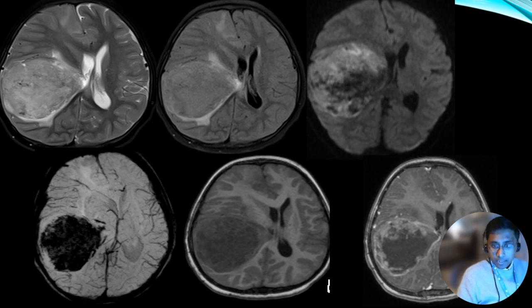Let's go on to another subtype of the high-grade glioma. So what we see here is a diffuse expansile mass which is involving the right cerebral hemisphere, predominantly involving the right temporal lobe. Again, we can see that the mass is quite heterogeneous in T2. It has an intermediate signal, relatively well-defined borders, and some degree of perilesional edema. There is some diffusion restriction predominantly along the anterior and lateral aspects of the mass, and the mass is showing large areas of hemorrhage within and some degree of calcifications as well.